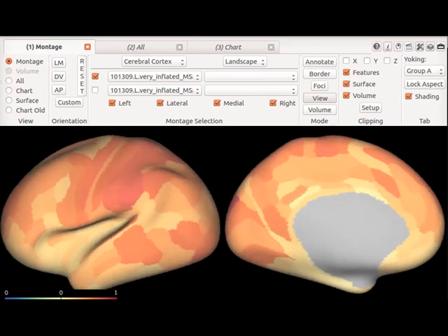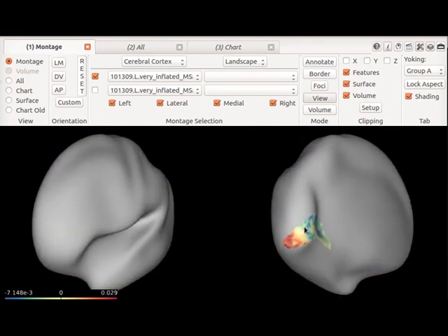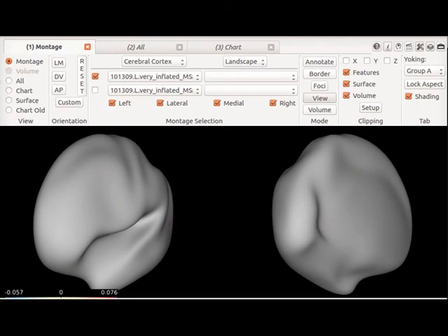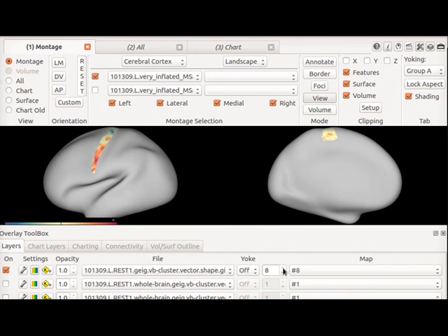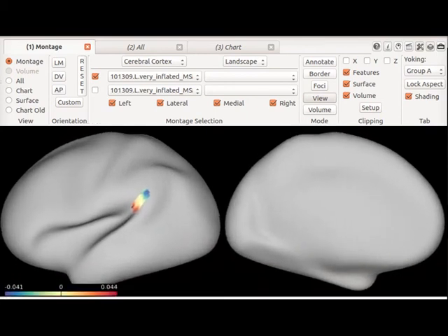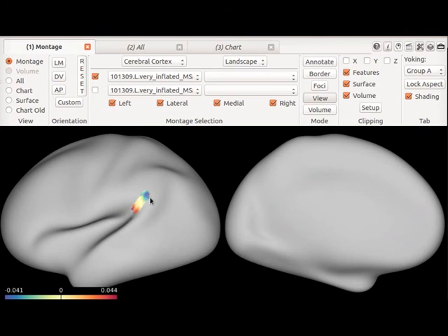And we can have the gradient map now by going to the vector. And as you can see over here, you'll have the different parcels. I will show you what this looks like. So if you just move through each parcel, you will find different parcels, and you will see the relationships within that parcel. So over here you have a gradient that goes from here to here. And you can pull out the VB index to see how distinct are these two intra-cluster regions. Okay, so that's the clustered.